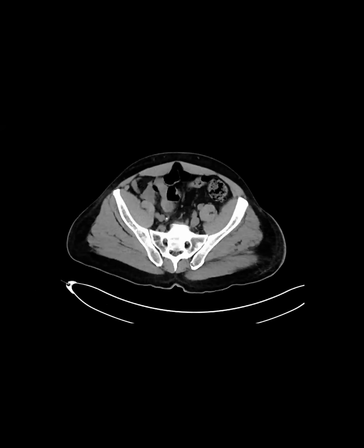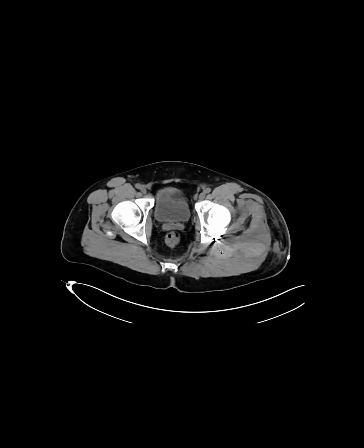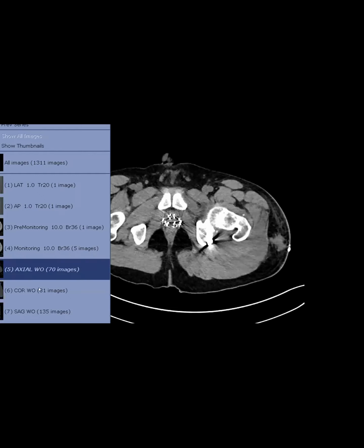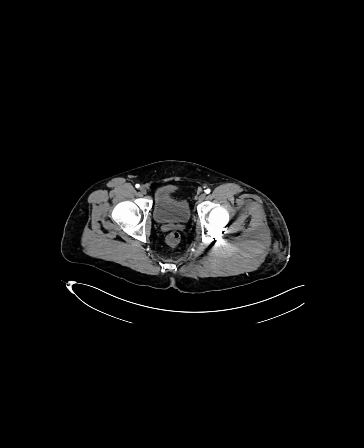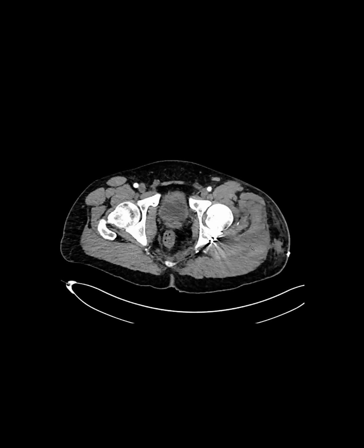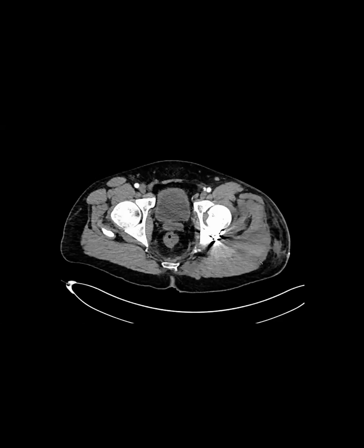So this is the CTA non-con first, and we can actually see that there is a hyperdense collection now in the gluteal muscles. And then going to our arterial phase, our blush is gone. So basically we saw it rupture. Because it ruptured, it tamponaded the pseudoaneurysm, so the pseudoaneurysm is now gone. The patient didn't lose too much blood, their hemoglobin was stable. So they basically just watched it conservatively.